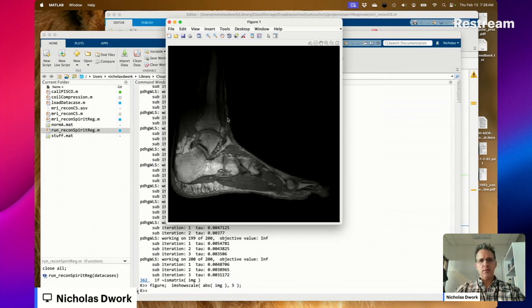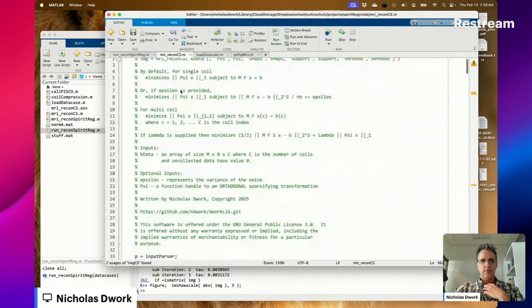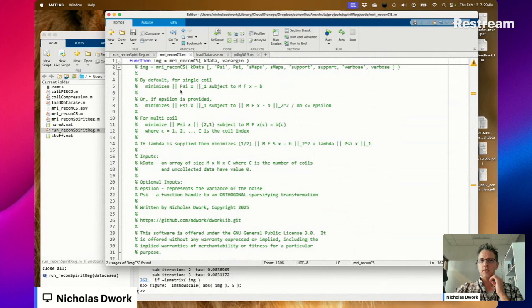Maybe this, oh, wait, why does it go bright, dark, bright? That's strange, isn't it? Maybe these are just extreme wavelet artifacts here. Nice detail here. Lots of artifacts, though. Lots of wavelet artifacts. Is there a bug in this code? Who on earth knows?